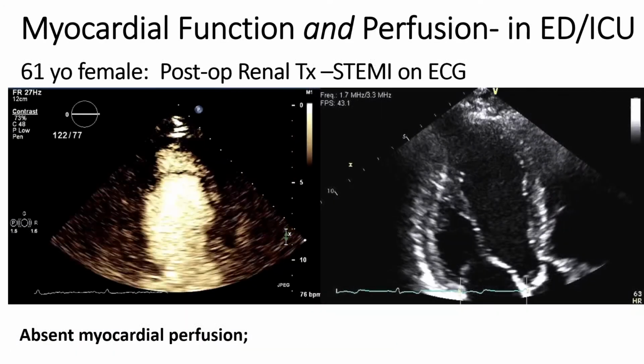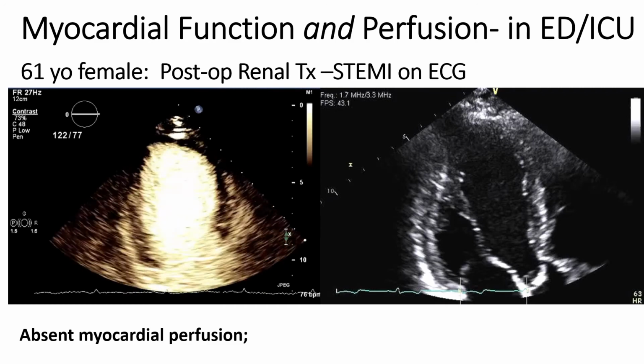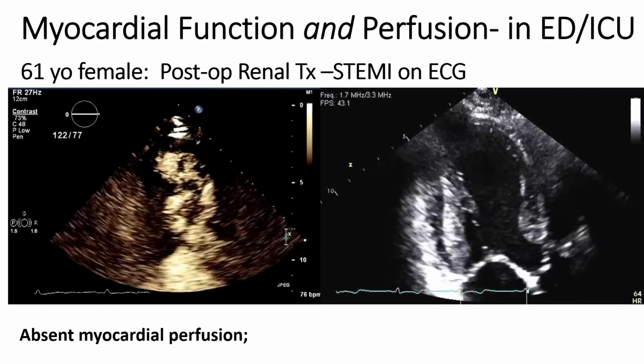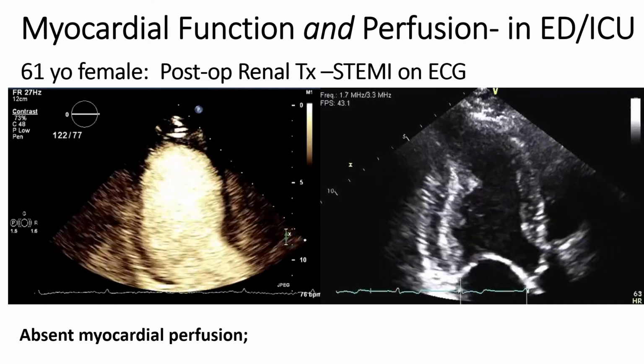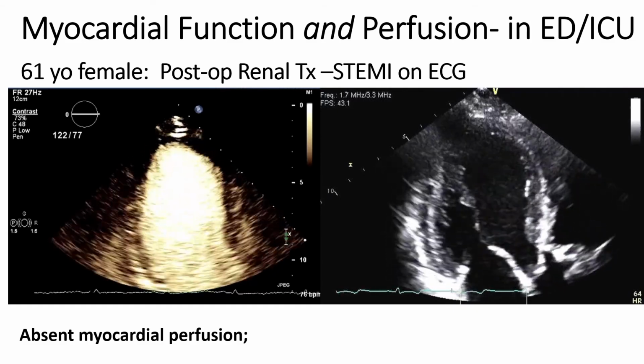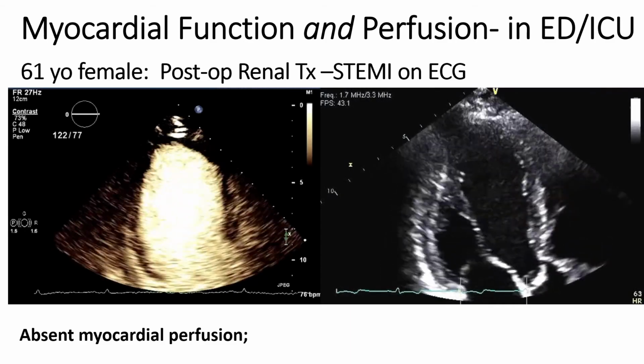Now, I'd like you to contrast the last case to this case. This is a 61-year-old female who was a couple of days post-op renal transplant, and a routine electrocardiogram before dismissal was read as having STEMI. She had significant ST segment elevations in the anterior precordial leads.